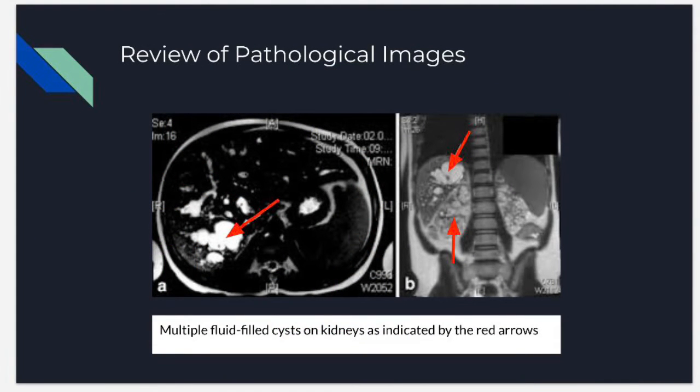And here's just some more pathological images. Again, fluid-filled cysts on the kidneys as indicated by the red arrows.